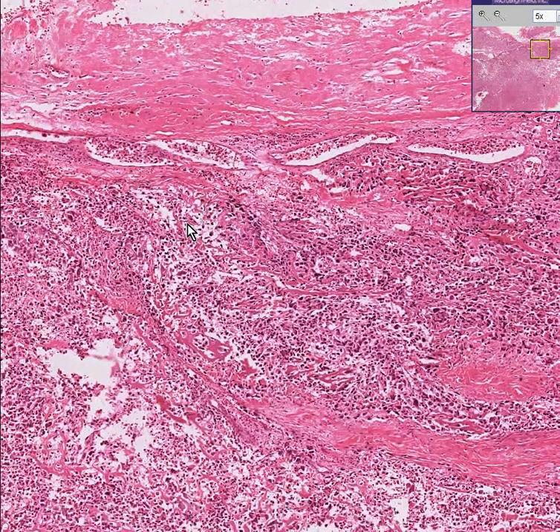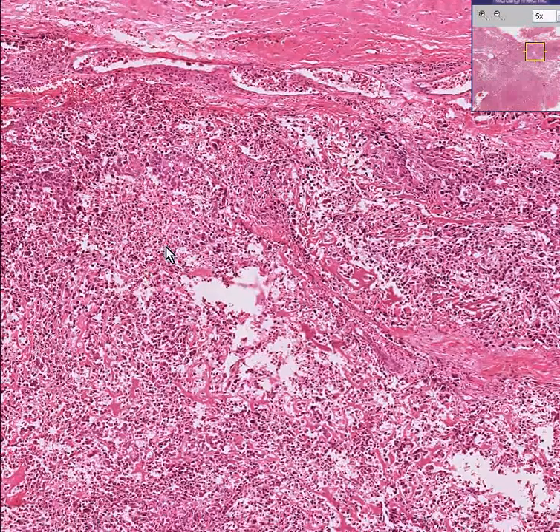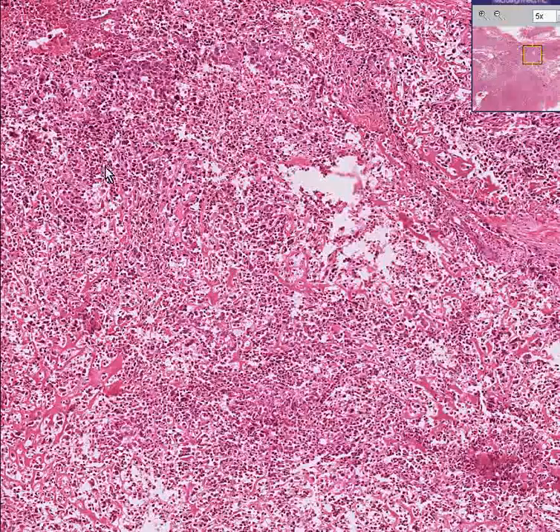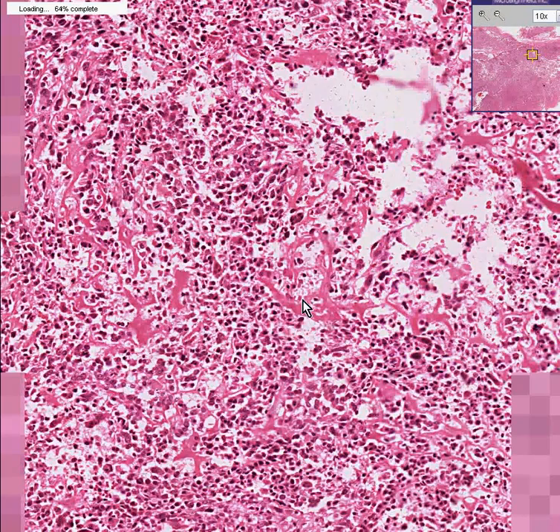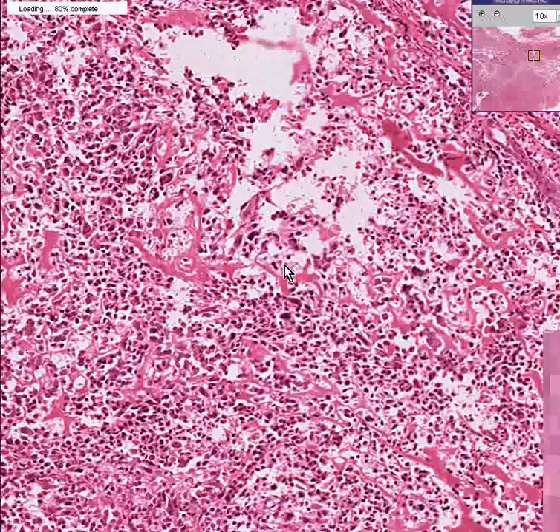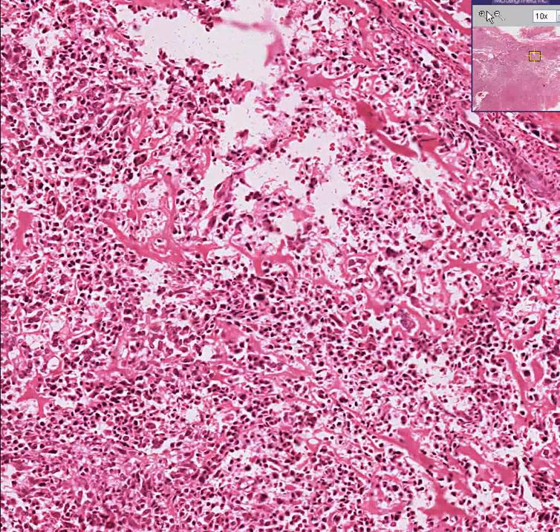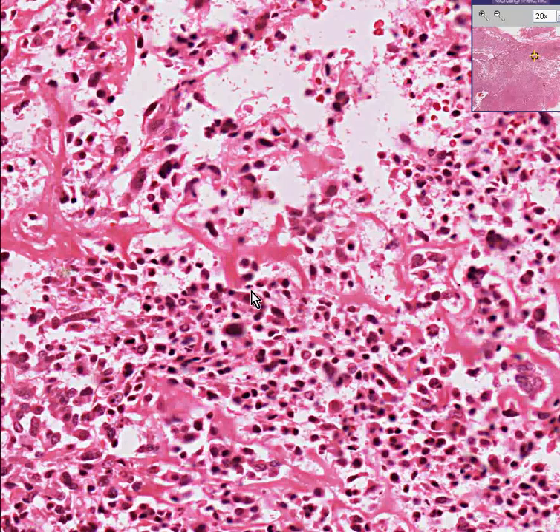And even though there might not be much of what you would call normal or residual bone here, when you look at the entire tumor itself, consisting of these small cells, notice how they are making this primitive osteoid. Osteoid is defined as bone before it is mineralized. And very often, osteoid, even a normal osteoid, may look something like this.